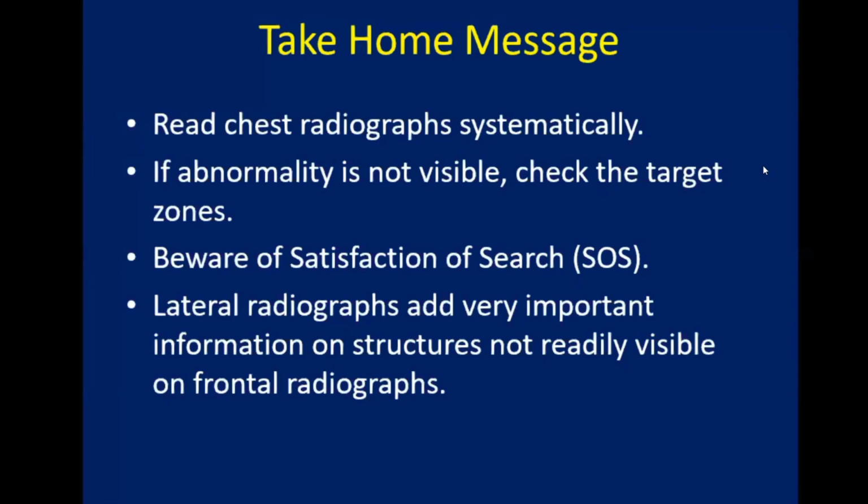If an abnormality is not visible, particularly in the exam setting, always check the target zones. Remember to be careful to avoid satisfaction of search, and this can be avoided, as I mentioned, by following the systematic approach. Lateral radiographs add very important information on structures not readily visible on frontal radiographs.